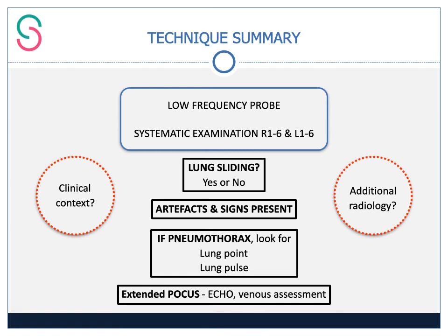Once you've done that, the next question is, I've finished the lung ultrasound component. This is what I think may be the diagnosis. How can I confirm that with some additional ultrasound POCUS information? And this may include a DVT scan, it may include an echocardiogram, it may include an abdominal scan looking for free fluid in the abdomen.